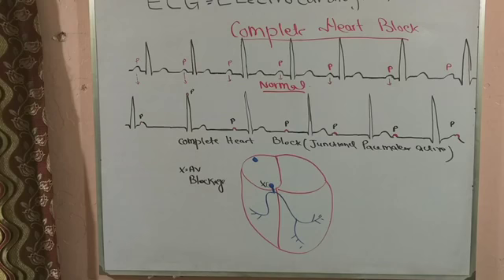But always remember one thing, ECG paper is an innocent paper. It is only an event recorder. When the atria depolarizes, it records the P wave. When the ventricles depolarize, it records the QRS complexes. When all this was happening in synchrony, in harmony, it was recording a P before each QRS complex. But here the ECG machine and the paper have to record both these events, and they are not in harmony. They are desynchronized. This is happening at one time, that at another time.